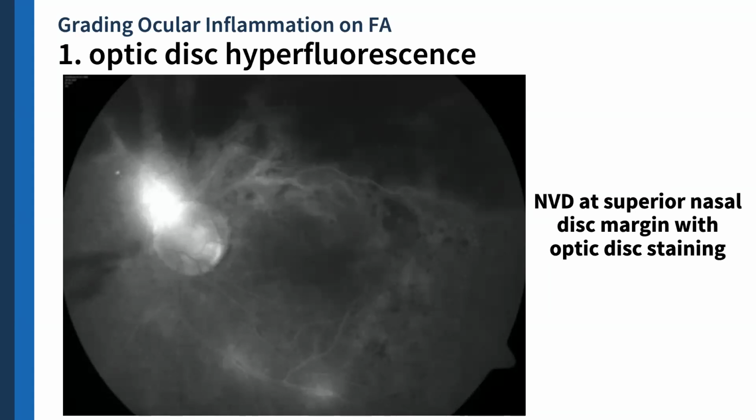But neovascularization can be a consequence of optic disc inflammation, but it's not necessarily optic disc inflammation. Okay, so just important lang for you to make that distinction when you say optic disc leakage versus neovascularization at the disc.